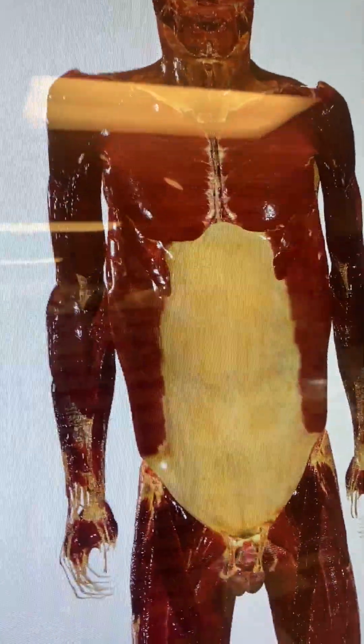If you tap in here, choose the histology here, on the left side or on the top you can see the 3D, and then on the right side of the table or at the bottom there is just blank space. This blank space is giving you space for the histology part of the structure you choose.